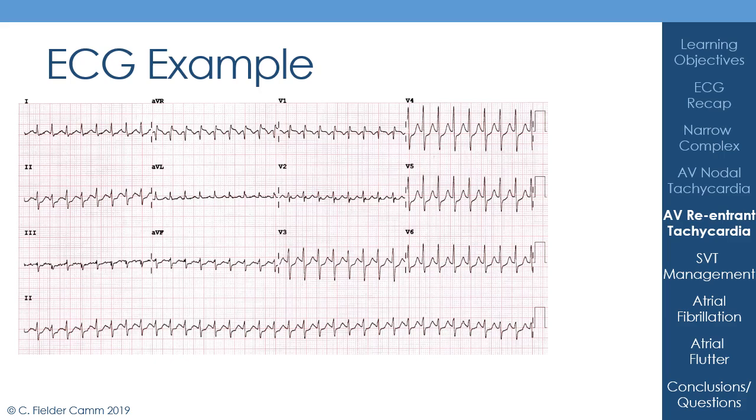Okay, so hopefully you've had a chance to go through this. So let's start at the beginning. I haven't provided you any details as usual here, but I'll give you some now. It's a relatively young person and they're complaining of palpitations. Technical aspects of the ECG appear to be fine. The calibration on that right-hand side you can see is as we would expect.